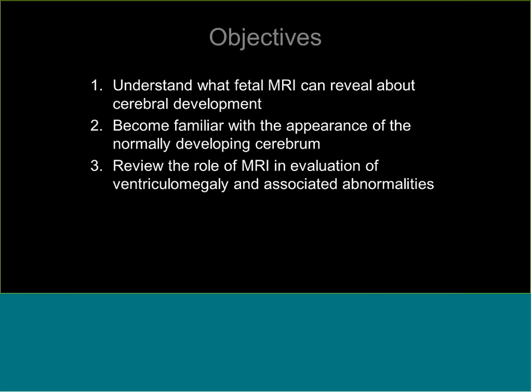So the objective is we want to understand what fetal MRI can reveal about cerebral development, become familiar with the appearance of the normally developing cerebrum, and review the role of MRI in evaluation of ventriculomegaly and associated abnormalities, since that's the most common referral for supratentorial anomalies in fetuses.